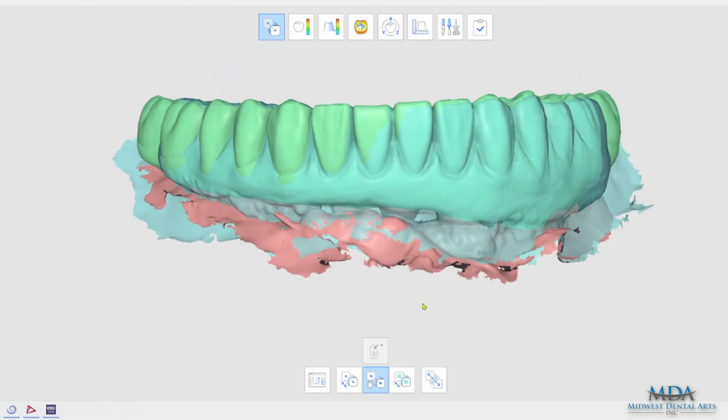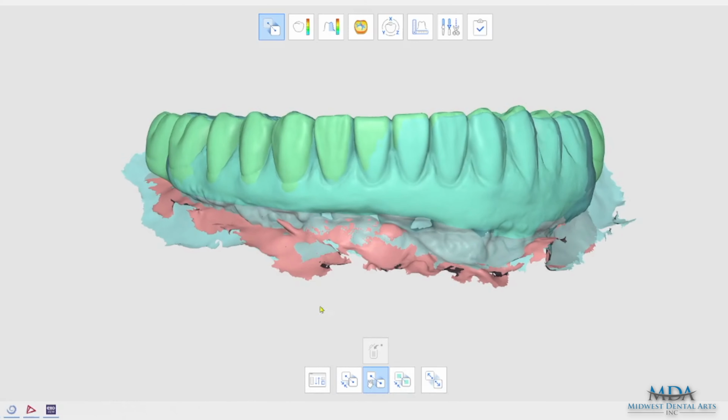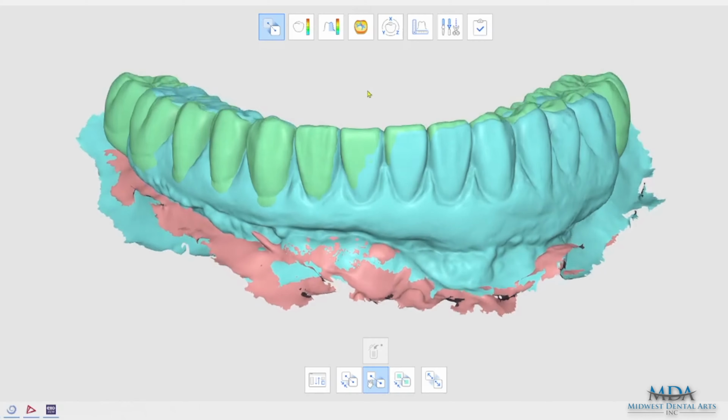And so if I wanted to move that tissue and recheck it, the nice thing is you can drag different STLs and kind of cross-reference and match and compare. But this is a big issue with scanning, is just making sure that your lower tissue alignment to the actual scan of the temps is accurate.